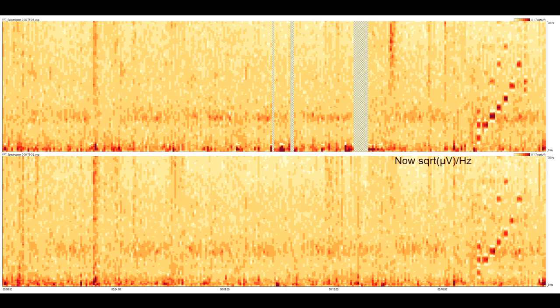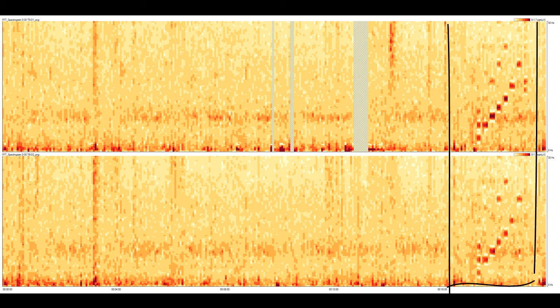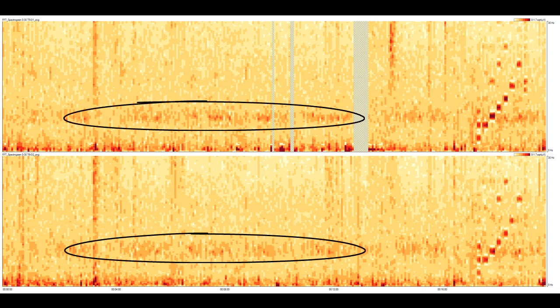This is a square root scale, which is obtained simply by taking the square root of the linear z-axis values. As shown here, this allows better painting of the full range of EEG activity. Not only are the photic driving responses well visualized, but the harmonics are a bit better evident, and the patient's resting alpha activity is also more obvious.